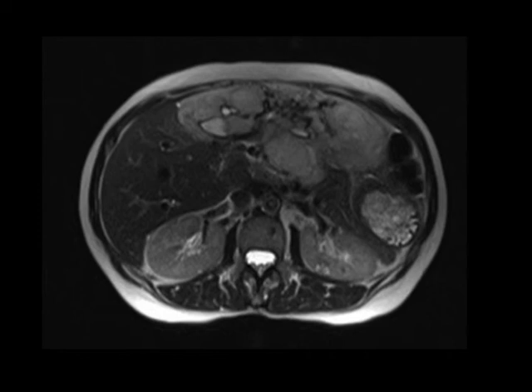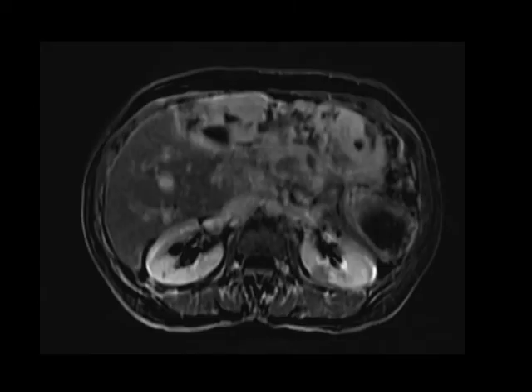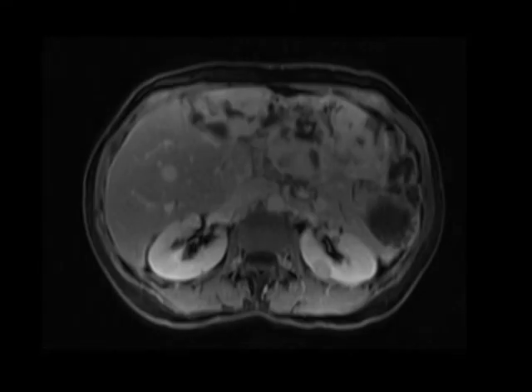And if you look at the images acquired many minutes after the initial injection of contrast, large portions of the mass are filling in with contrast. This is a classic example of a giant hemangioma. It's large, it looks really ugly, but at the end of the day, it's still a benign entity, something that you don't need to do anything about, particularly in a patient who's not having any symptoms or other clinical issues. A giant hemangioma.